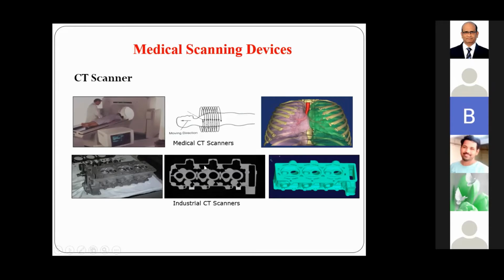We can go up to the 0.1 mm level, so we can convert into 0.1 mm layers. In each layer you can check the small holes also, the blowholes and porosities. You can find all of these when taking CT images with micro CT. That is why CT scanners are used in industry. But I wanted to extract my tissue, the bony tissues or soft tissues or hard tissues. For that purpose we use the CT scanner and MRI scanner.